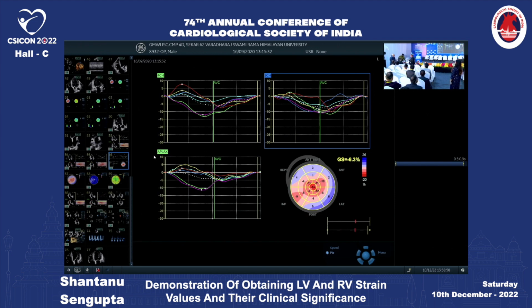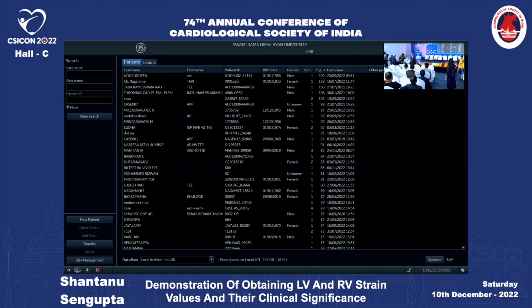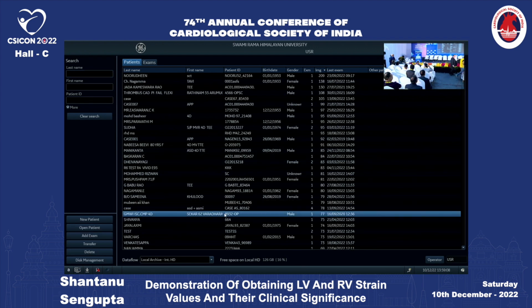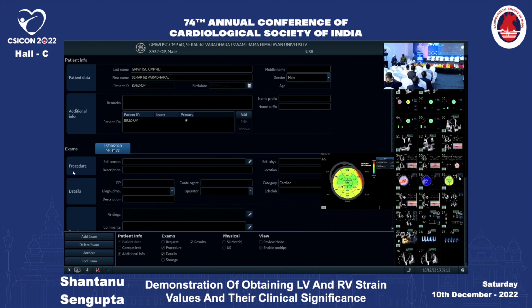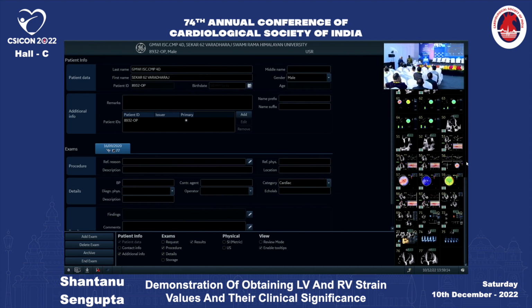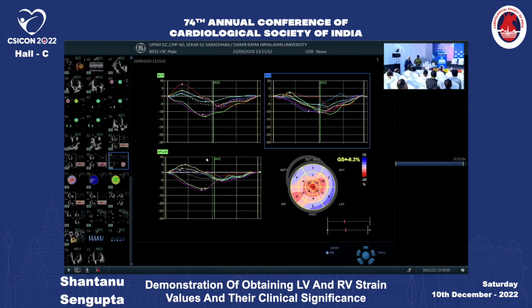Did you speak about the post-systolic contraction? No, I was going to that. There are already questions on this. Okay, you can just show that case. What Dr. Nanda wanted me to show. Where is it? In this case, it is not there, sir. Okay, it is there. Yeah, it is here. It is a saved data.